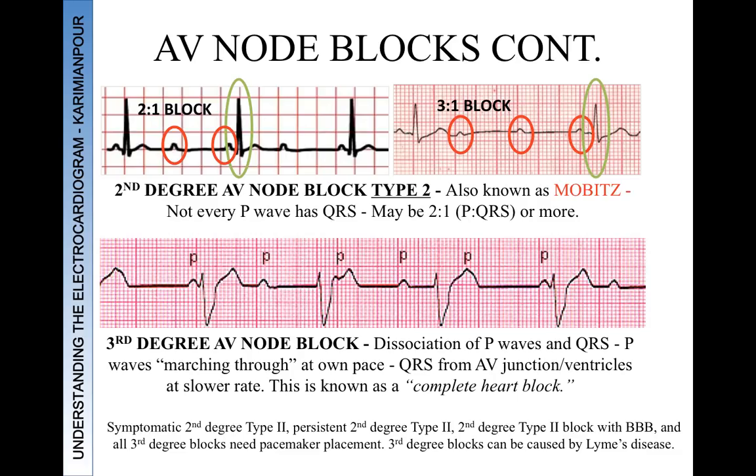And one quick tip, so if you have an AV node block and a right bundle branch block and a left anterior fascicular block, oftentimes people refer to this as a trifascicular block. It is a misnomer because there are no three fascicles that are blocked. It's sort of like a bifascicular block, a right bundle and a left anterior fascicular block, plus an AV node block, and sometimes people refer to it as a trifascicular block, and that's obviously bad.